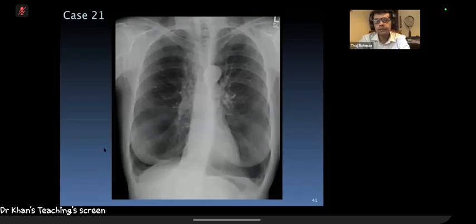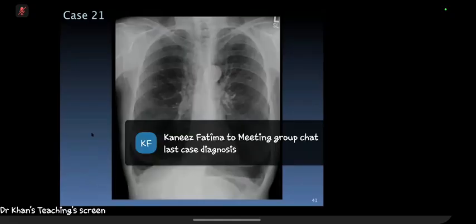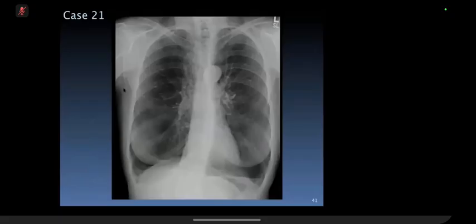Do you want to have a go at this? Yep. So this is a frontal chest radiograph of an adult female patient. Lung volumes are increased, and the hila appear elevated bilaterally. Is it hilar elevation or an apparent appearance because of the hyperexpansion of the lower lungs? Okay, so it will be the latter then.